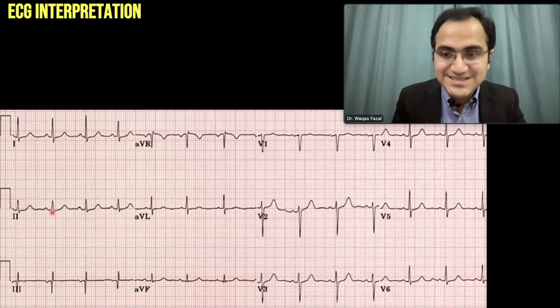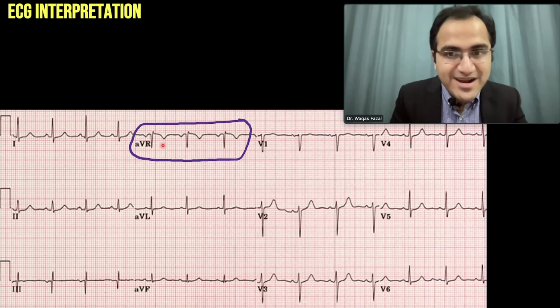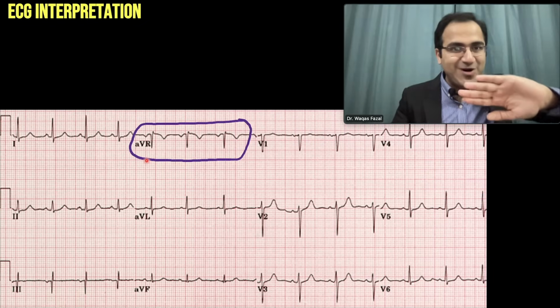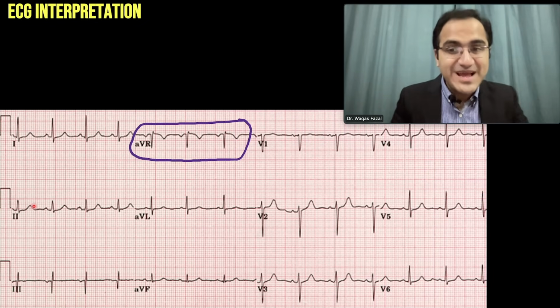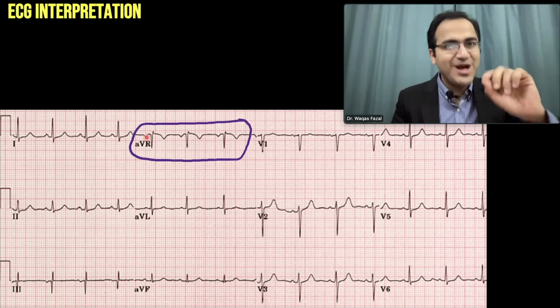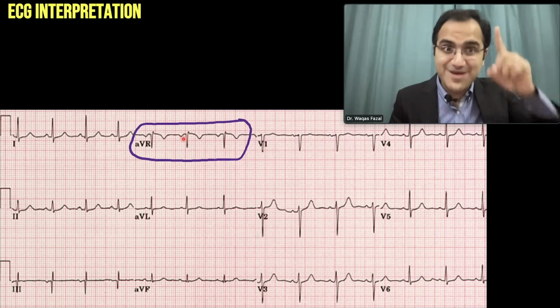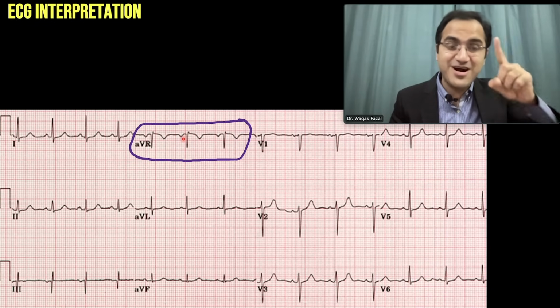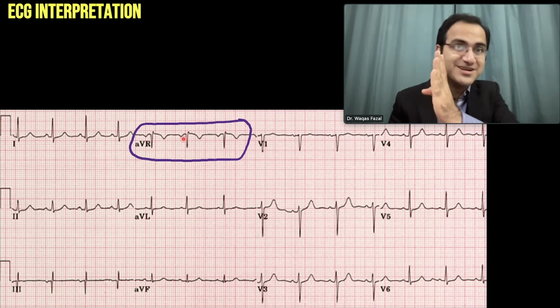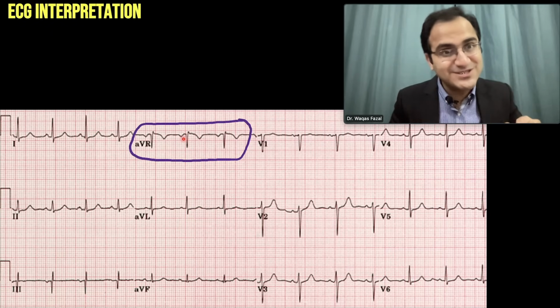Now if you look at this ECG, there is P, QRS and T wave, and it is very prominent and beautiful in lead 2. And if you look at AVR, AVR is lead 2 but upside down. AVR is fully negative. AVR is just the copy of lead 2, but fully upside down. Now what's the importance of understanding this? If in any ECG, AVR has a positive deflection, it's abnormal. It means that the axis of the heart has changed. Current flow has changed its path, therefore AVR is showing a positive deflection.